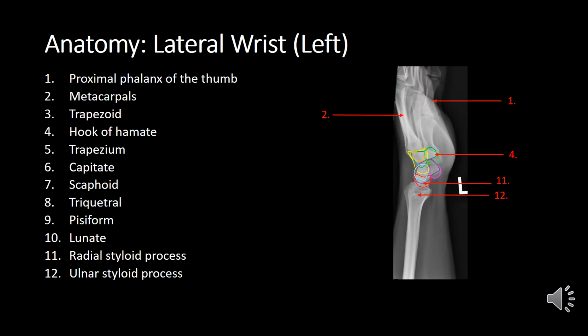Here's a quick slide of the lateral projection, just to remind you of the anatomy. You may wish to pause, otherwise just let the video run and we'll move on to the next.